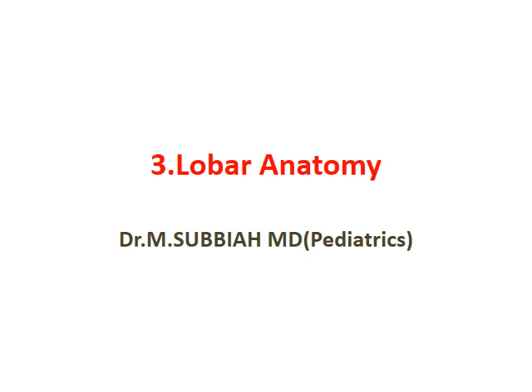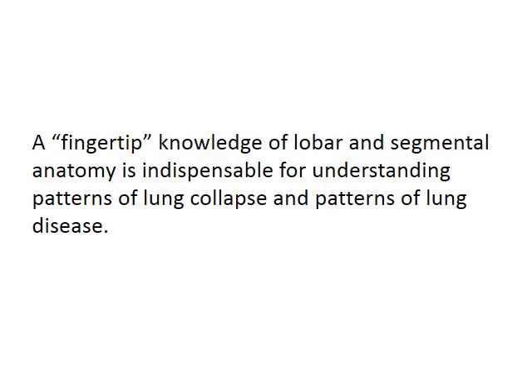Today we are going to learn about lobar anatomy. It's anatomy of the lung lobes. A fingertip knowledge of lobar and segmental anatomy is essential for understanding patterns of lung collapse and patterns of lung disease.